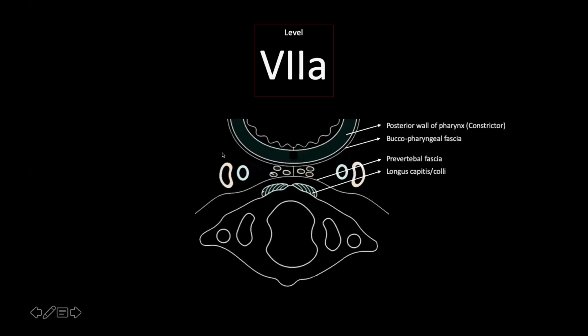So posterior to the pharynx, retropharyngeal, is your retropharyngeal group of lymph nodes. Till now, I was constantly mentioning that you include only up to the medial border of the internal carotid artery, because medial to that will be another nodal level. This other nodal level I was talking about is level 7A, from C1 to the cranial edge of the hyoid bone. This space medial to the carotid artery, between the pharyngeal constrictor and your prevertebral muscle, is your retropharyngeal group of lymph nodes.